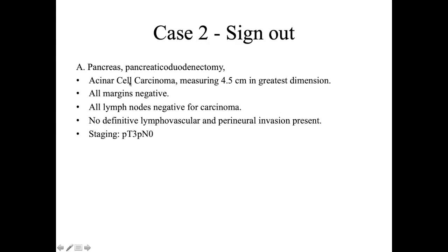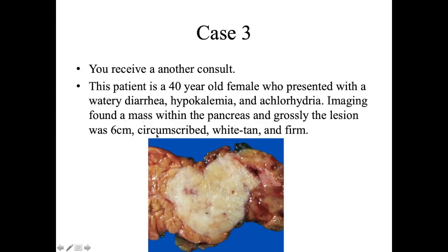pancreaticoduodenectomy, acinar cell carcinoma, measuring, put how big it is, comment on the margins, comment on the lymph nodes, see whether there's any perineural or lymphovascular invasion. In this case, we did not see any, and stage it. Great. Let's move on to case 3.